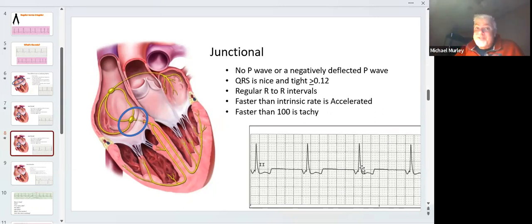Well, in this case, most likely yes, because it's coming from just above that AV node or at the top end where there are parasympathetic receptor sites. So we can block those with atropine. It's an anticholinergic. It blocks the parasympathetic and it speeds the conduction velocity up here. So it might just speed it up. I would give it a shot.